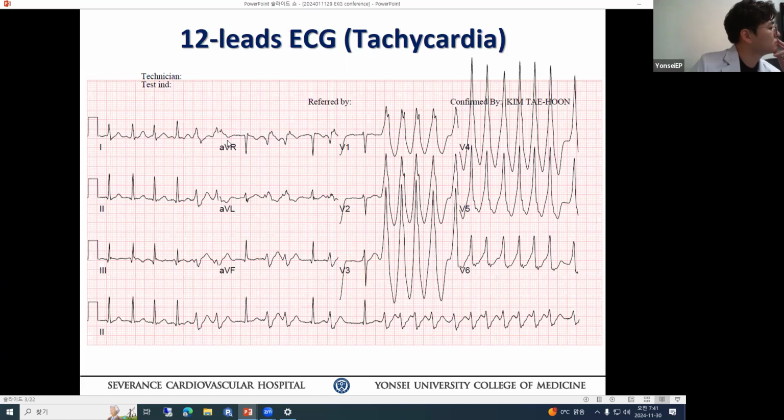So it's the left side, right? It's not right side, because your lead 1 is positive. Delta is positive, first 40 millisecond. And then your lead 3 is what? Negative initial component. Lead 3, pre-excitation. Yeah, that's it. Okay. And then lead aVF, almost isoelectric.